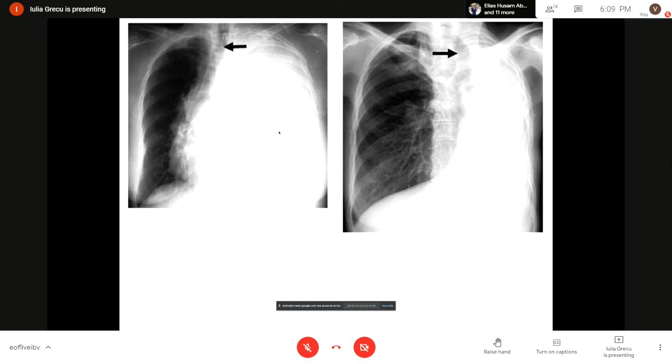So what is your diagnosis in this case? Could it be like blood? Okay, so when I am asking you about the diagnosis, I don't refer to specifically saying what kind of fluid is in there, what structure it has.